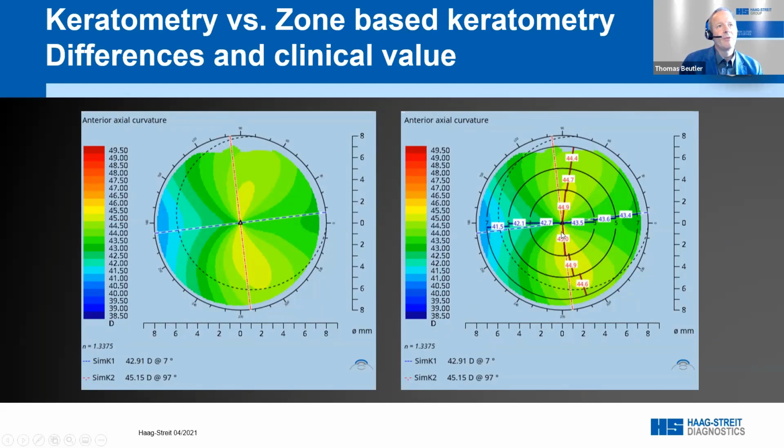We have steep meridian to the bottom, which is almost 90 degrees to the 2 flat ones. And we see that the upper part is a little bit tilted. And that is what's going to make the result not perfect if you would implant a toric IOL here. Still, we can see it's not so bad in the mid-central zone and up to 5 millimeters. The whole thing is still quite well aligned, at least for the inferior part and for the flat meridian.